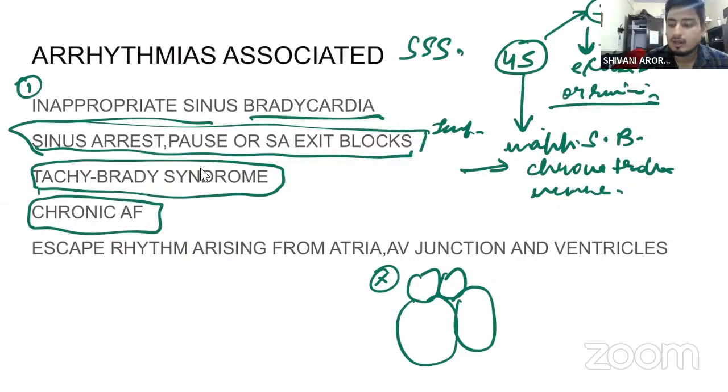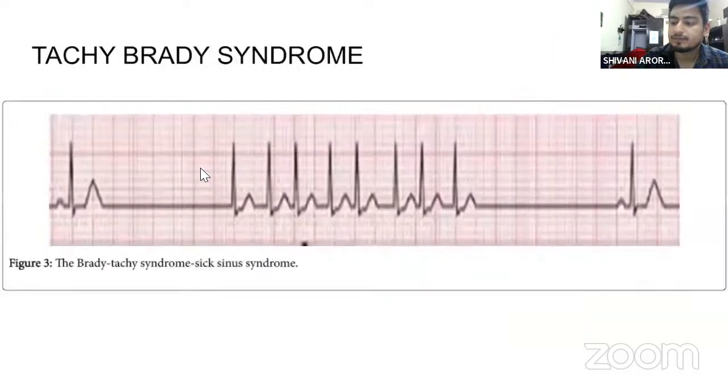Clear? Now let us move to the next slide. Okay. So we have this tachy-brady syndrome.